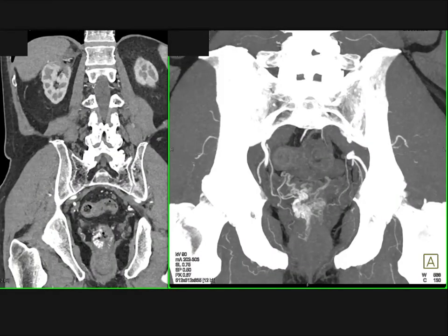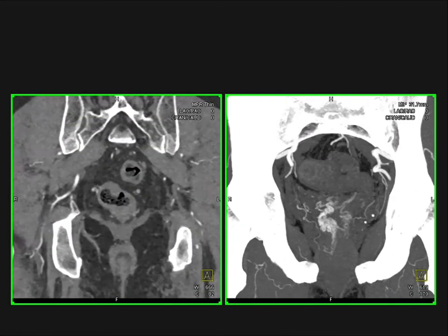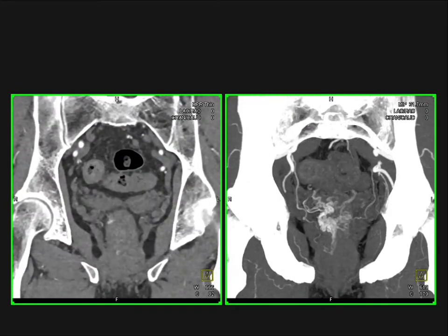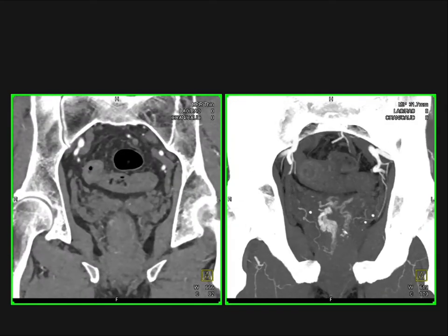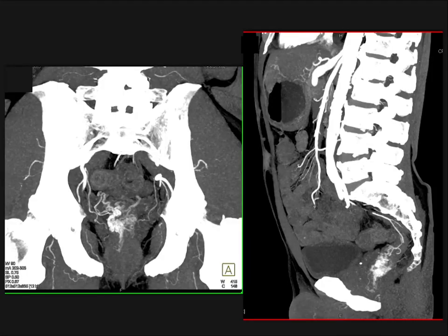Now sometimes again on the venous phase, in fact, it's going to show better. So here we're going through the different phases, and look at the blush when I do the MIP imaging. Again, think about that, but MIP really can be very helpful in that regard. And here it is again. I'm scrolling through the data sets. The varices and bleeding are mainly in the right wall. The prominent varices are diffusely seen, very nicely shown off the inferior vessels coming downward. And again, beautifully shown as you look at the sagittal and coronal view. So, very, very important.